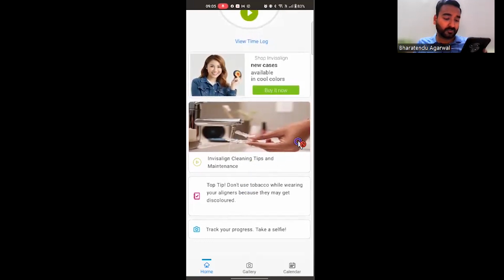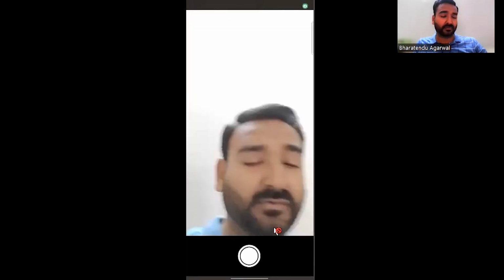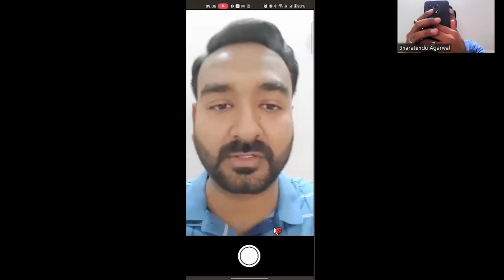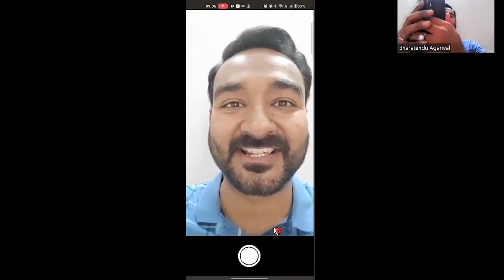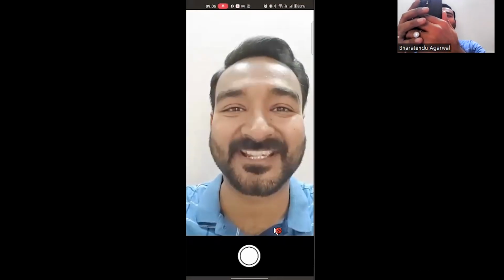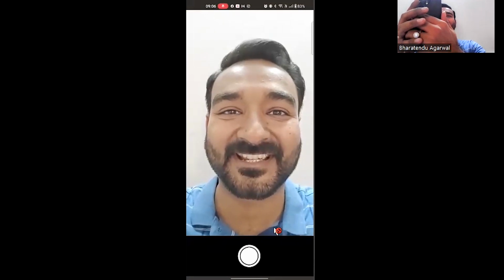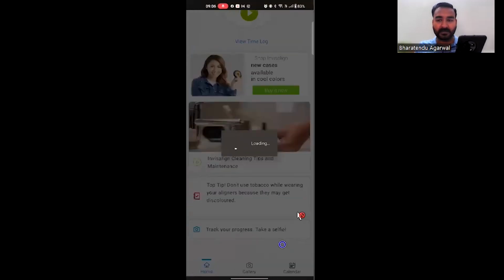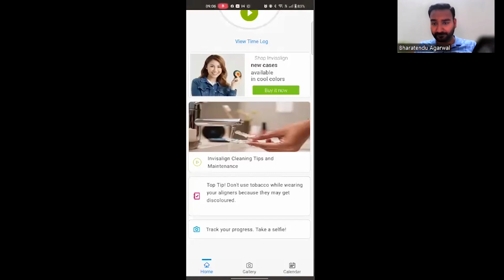It says, do not use tobacco while wearing your aligners because they might get discolored. Track your progress, take a selfie. So I would have done that to show you, but as we know, all right, this is possible. Let me do this in section. So yeah, this picture I'm all right with. And as you can notice, I'm already wearing the aligners. So I'll save it at the moment and we'll keep track of this eventually.